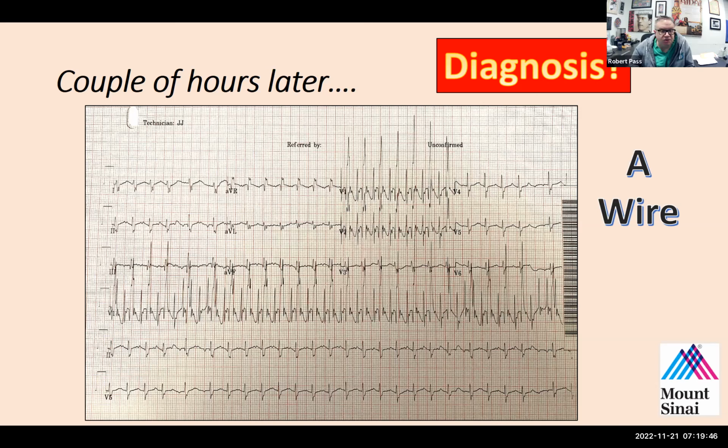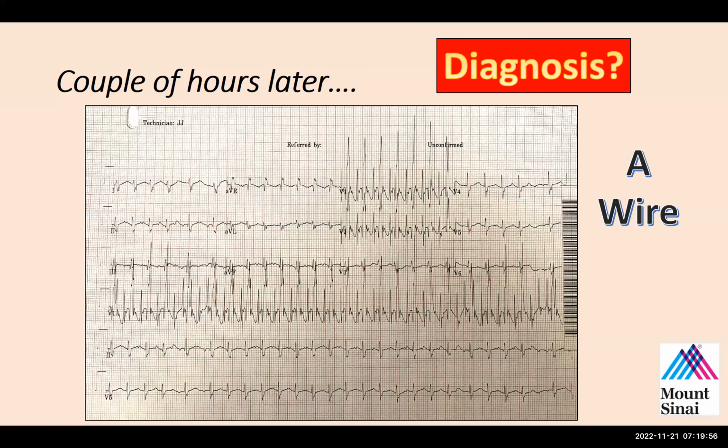Well, you can determine exactly what the atrial rate is, because you have the atrial electrogram, which is particularly easy to see. We saw there were 3 A's to each V, so it would be 3 to 1. That would be pretty fast. It would have to be above 450 to atrial pace.